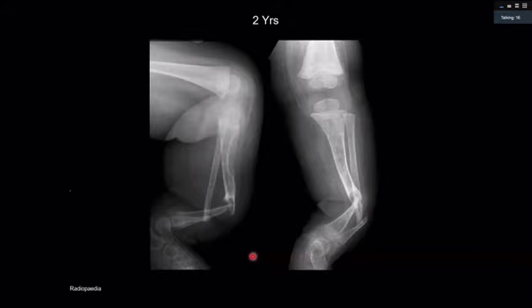I would want to look at other x-rays of the patient to look for other fractures to help me confirm the diagnosis. I'd also want to ask the clinical team for more information, for example, do they have a hearing aid or any deafness? Other things I would want to consider would be neurofibromatosis, or I should also consider NAI and malunited healed fractures.